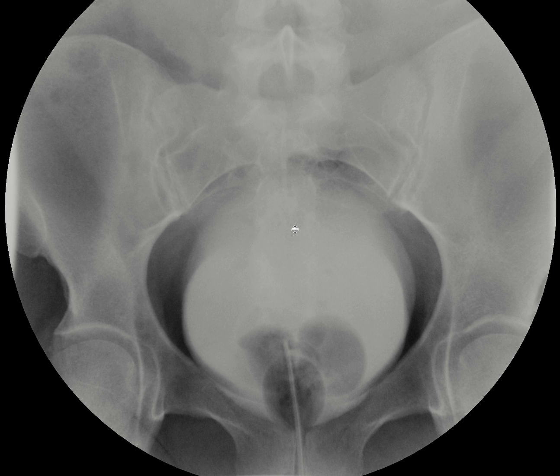This is a patient who is presenting with multiple urinary tract infections, and so a voiding cystourethrogram was ordered to be able to evaluate for some kind of cause, maybe due to reflux or some other congenital abnormality. And here we can see the bladder opacifying with contrast.